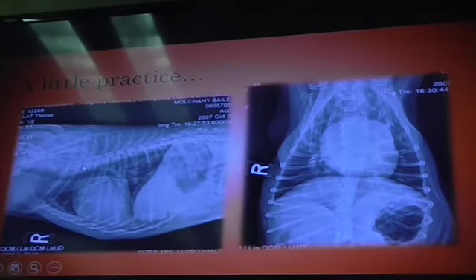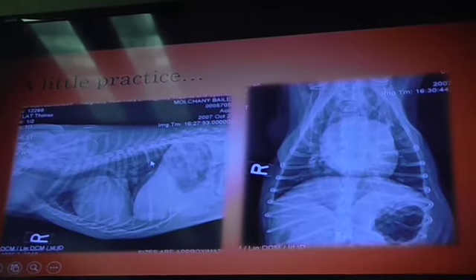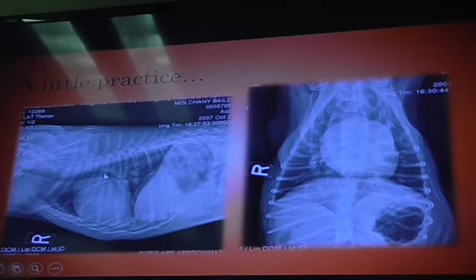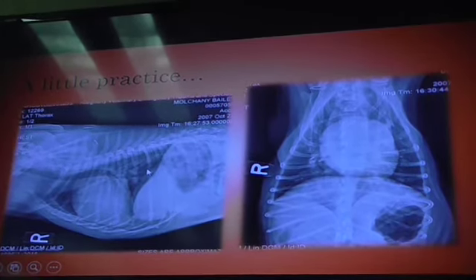Okay? So when we look at a thoracic image, we have it split up in cranial lung lobes, caudal lung lobes, correct? Y'all should have had that first year and second year. Then, when we talk about how we visualize the vessels, remember I said it's going to be hard to really differentiate which vessels are what in the caudal.